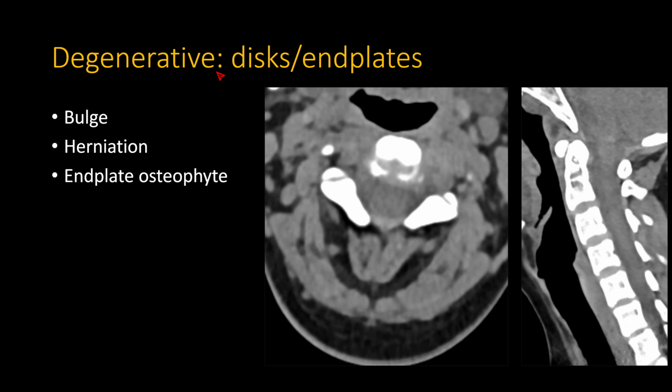Finally, I end with talking about degenerative findings. Now, if you're doing something for trauma, you don't spend a lot of time going level by level, describing degenerative changes at each level. But if the study is done for follow-up of degenerative disease, obviously you go level by level. And at each level, typically beginning at C2, C3, you describe every detail of the degenerative findings, as we'll go over. First things first, though, usually talk about C1, C2 arthropathy, if there is any arthropathy, and if there's any pannus formation posterior to the dens.